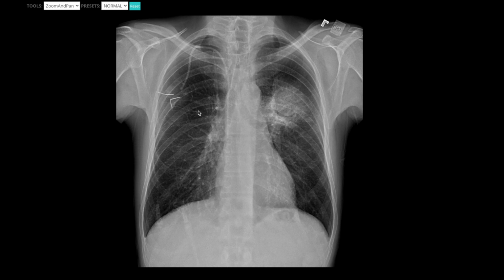But what they're concerned about is not the rib fracture itself, because that's just conservative. What they're really concerned about, or what you should be concerned about, is a pneumothorax, right? If you have any type of sharp body that's pointing towards the lung, what you're most concerned about is going to be some type of pneumothorax. So always go back to those major things.